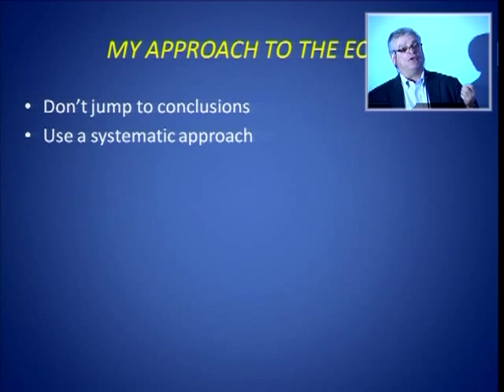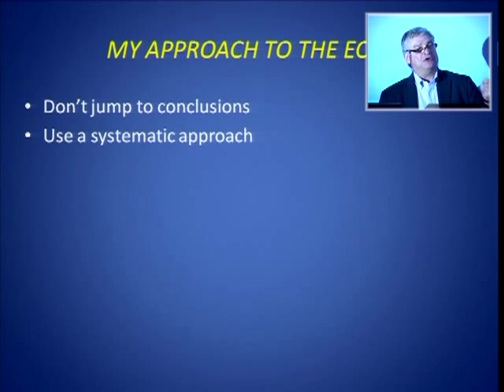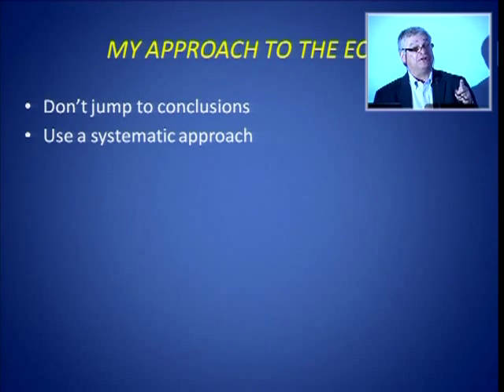For instance, if you see a QRS followed by a P, you say, I see a QRS followed by a P. You don't say, I see VA conduction, because it's not necessarily retrogradely conducted. They may not be related at all.